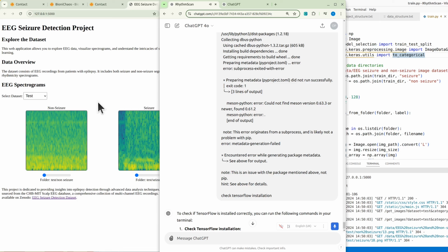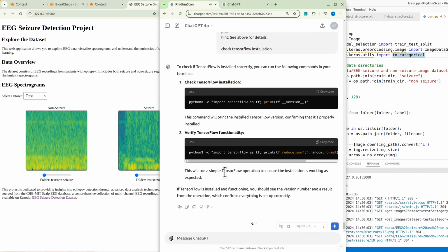In summary, this project uses a CNN to classify EEG images, aiming to assist in the detection of seizures by processing and analyzing brainwave data through image-based techniques. The code covers the entire process from loading and pre-processing the data to training, evaluating, and saving the model.